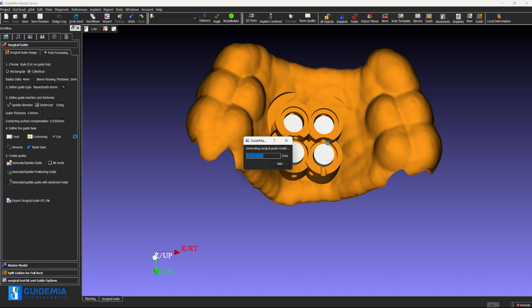And also you can see this area, we completely take care of the collisions between the housing area. When the implants are too close, those can have conflicts. In the example you sent to me, they have a collision there, they have an angle, it didn't quite clean up that area, but we automatically take care of this. So you see we are regenerating the guide. So after the generation, you see all those areas we can cut holes.